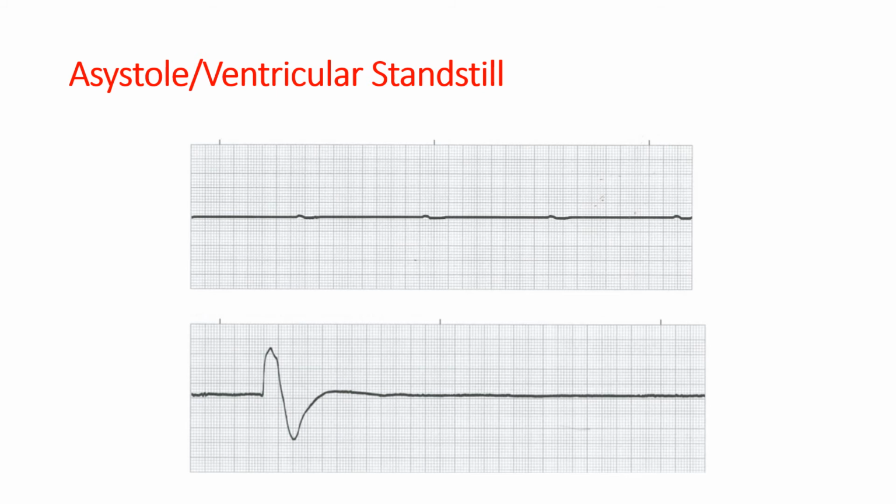In the bottom one, there are no P's and basically an absence of any ventricular activity except for this agonal beat, but this pretty much is also asystole. And again, there are no QRSs and there is no cardiac output.